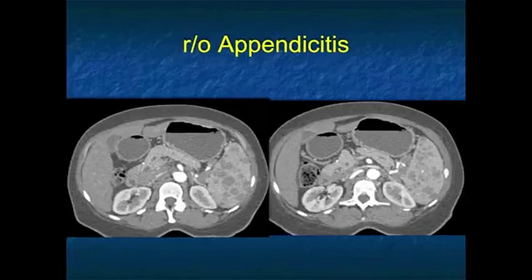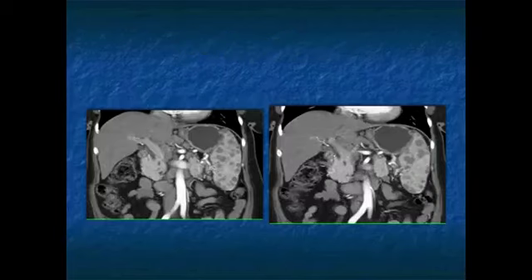Okay, next case, and I think you see the arrow on my computer, so things are going slow. But anyway, routine appendicitis, I'll get rid of the mystery: the appendix was normal, but you see the spleen with multiple splenic lesions, and now we have an incidental finding, multiple splenic lesions, because the patient had right lower quadrant pain.